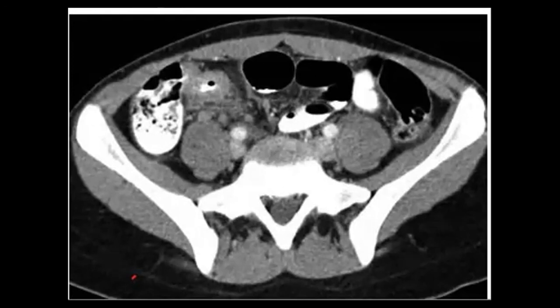Okay, I see that you took the break and started answering. So I recommend you, Sarah, to start to describe better, because it's not very easy to just put one differential diagnosis. But okay, I agree that maybe one of them. Amna, nice description. I see that you mentioned that there is wall thickening. So there is some thickening in the bowel loop, and you can imagine that this one will be in the right iliac fossa. So is it the terminal ileum? So thickened terminal ileum, and there is fat stranding and smudging.